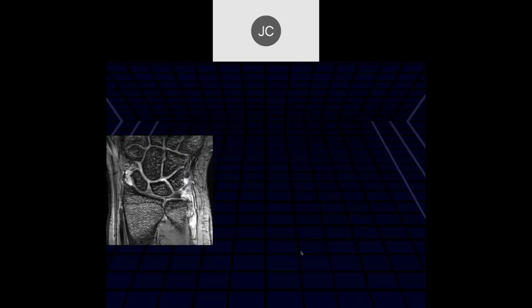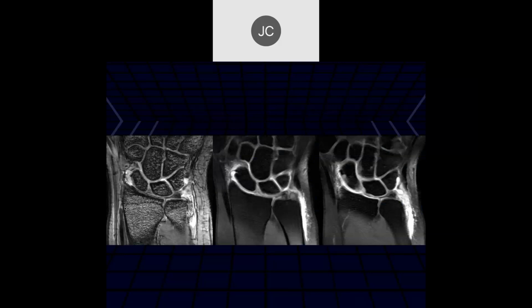Okay, Tayson. I do see some fluid kind of adjacent to the scaphoid there and in the prestyloid recess. Over here? Yeah. Scaphoid's over here. Yeah. I think this is an arthrogram. Okay.